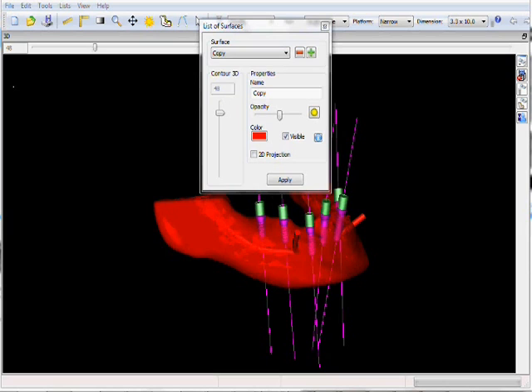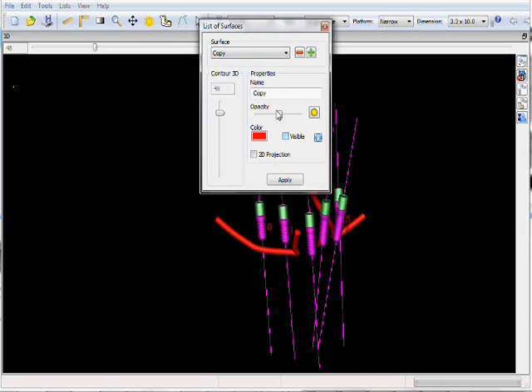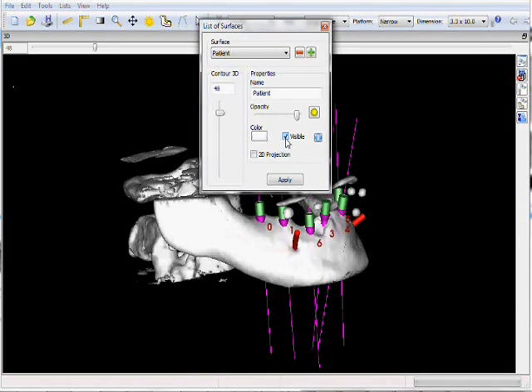And we can go ahead working with this surface, or we could hide it by unclicking the visible checkbox and switching back to any other surfaces that we have. Please note that the 3D Cut tool can be used to cut a part as well, not just to remove non-connected parts.